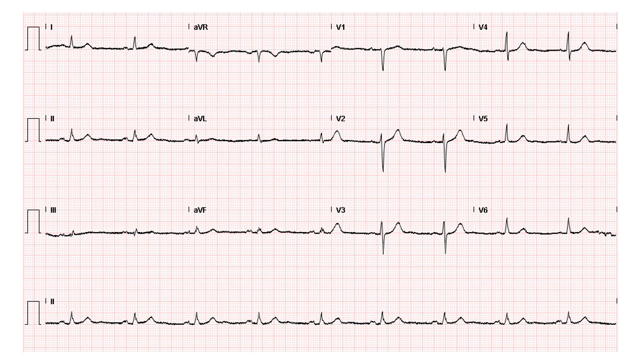So let's take a look at this EKG as an example. We've seen this EKG previously when we were attempting to determine rate in part one. And so I've been handed this EKG and I'm taking a look and I'm asking my two big questions at first. Is the rhythm regular? Yes, it is. So if I go through and look at my QRS complexes with the R to R intervals all the way across, they appear to be the same. My rhythm is regular. And then my next question is, is the QRS interval prolonged or is it normal?